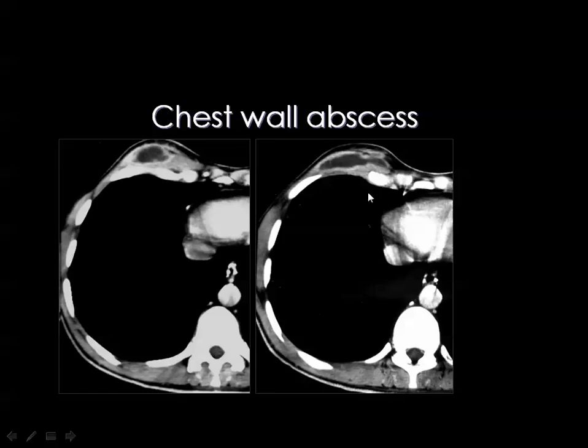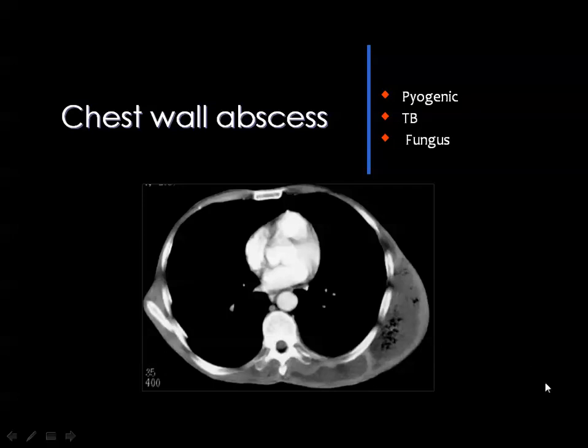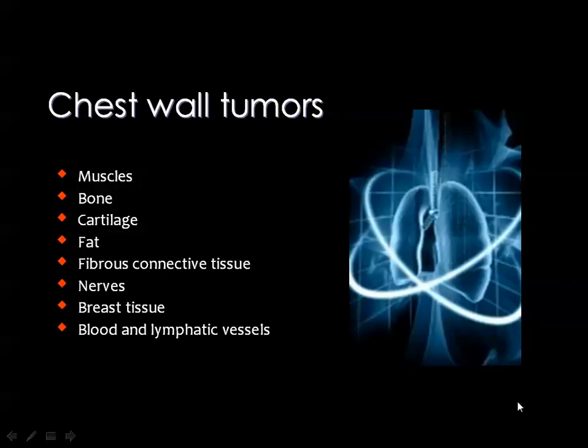The scan showed no evidence of intrathoracic extension. And this is also a classic appearance of a multilocular chest wall abscess seen here. And this is an internal septation. You can see air loculi, and you can see the thick enhancing margin and the fluid content. As I have said, you cannot predict the nature of the lesion unless you have samples from the inflamed tissue.